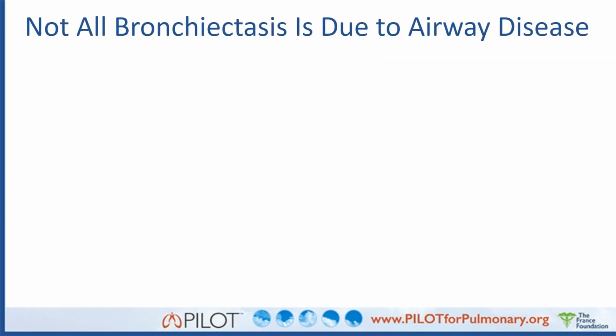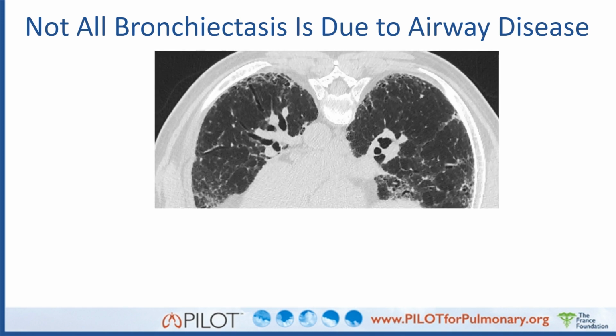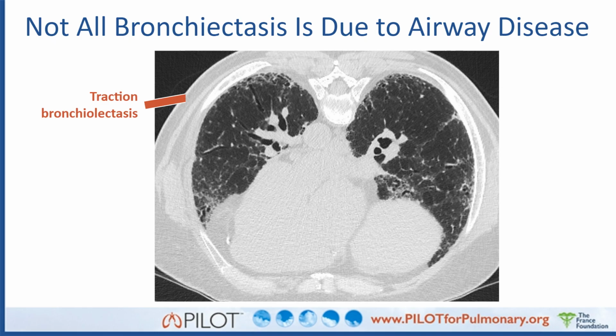There are bronchiectases that are intrinsic diseases of the bronchi themselves. In this case, the traction bronchiectasis is due to something outside of the bronchi pulling the bronchus open, a type of traction bronchiectasis, which is slightly different than intrinsic bronchiectasis, both giving you a dilated bronchus, though.